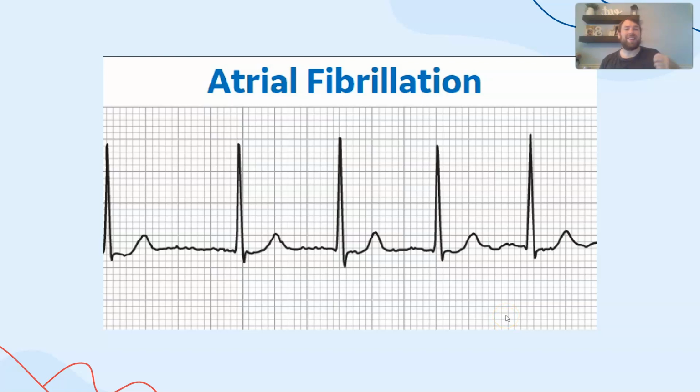We can also analyze the fibrillation of the atria and the ventricles, meaning the atypical contraction and conduction of the atrium and the ventricles. So here I have an EKG of atrial fibrillation. This would be the atrium not contracting at a normal time, place, or sequence of events.